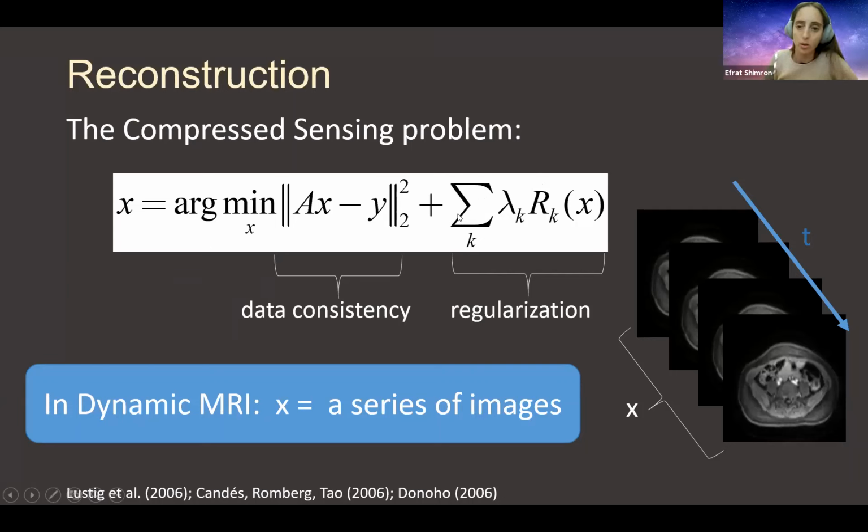But indeed, usually we have just a single regularization term, and we will see that in a minute. Okay, so the more you know about your data, the more you can use for the optimization problem, of course. I think that once we go into an example, this will be more clear.